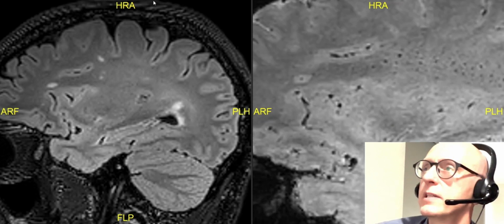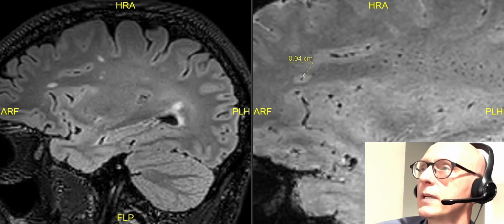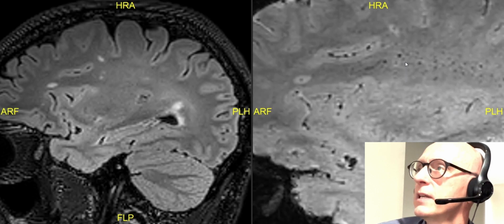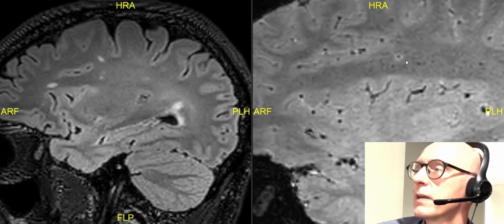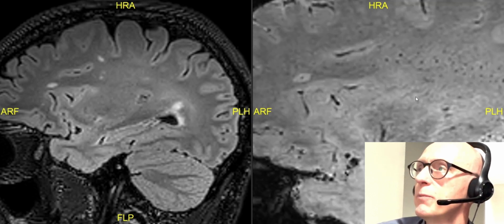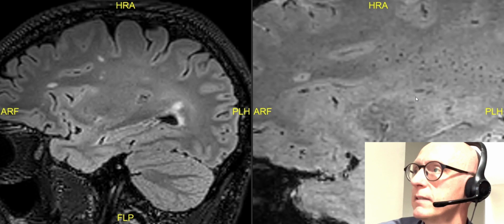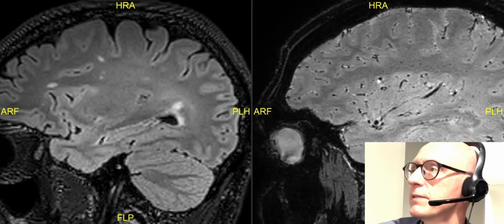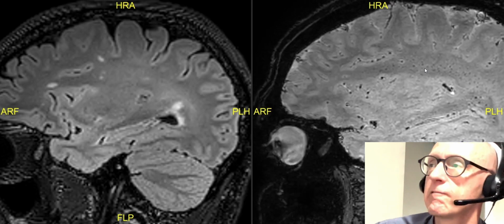And the vein itself needs to be less than 2 millimeters in diameter. I don't normally measure these. I think you can sort of eyeball it, but if we look here, for example, this vein is 1 millimeter in diameter. Quite a prominent vein, like the one we've got on this lesion here, is still only 1 millimeter or so in size. So we're really limiting it to the fine, delicate vessels running through the parenchyma, but most of the lesions that we've seen here fulfill that criteria.